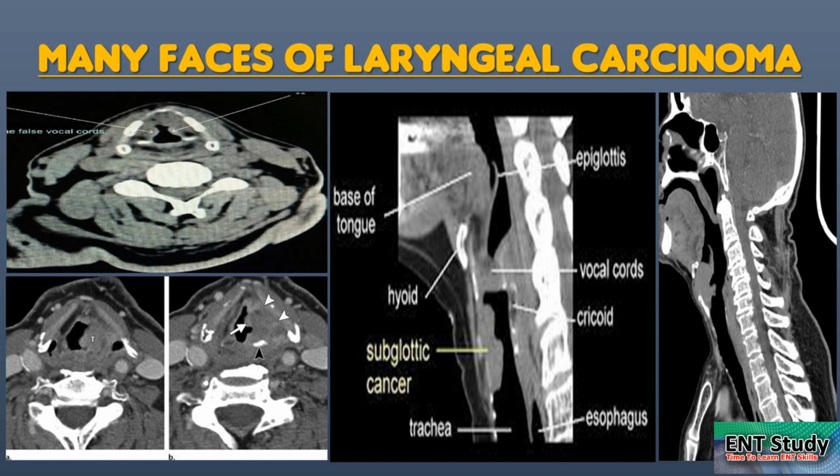Okay. So to see all this, again remember that you have to look at this. Look at the plane, you can see intact fat here. The fat here is gone.